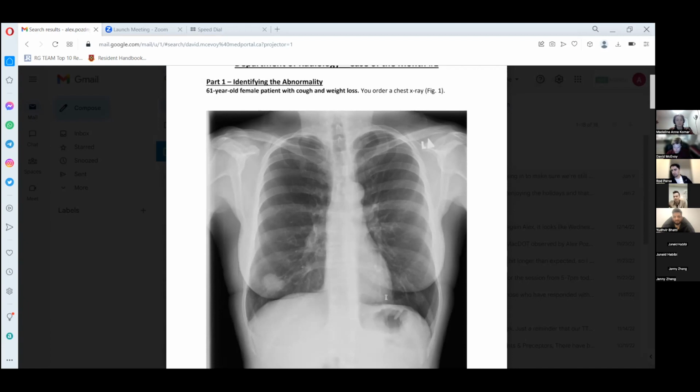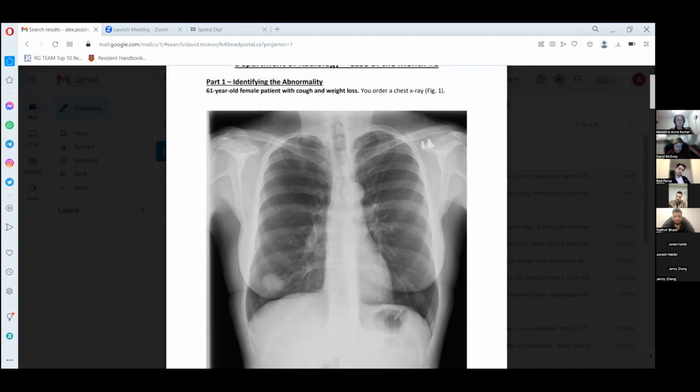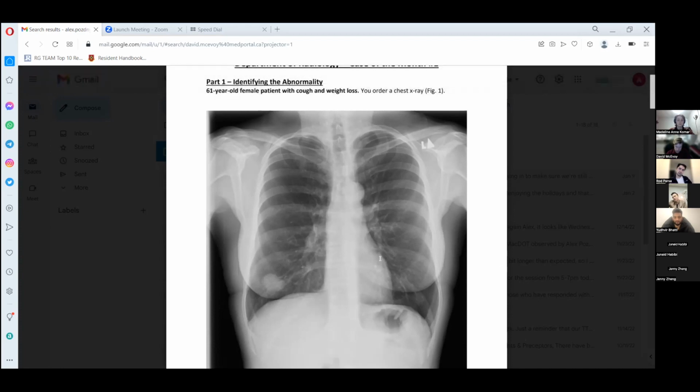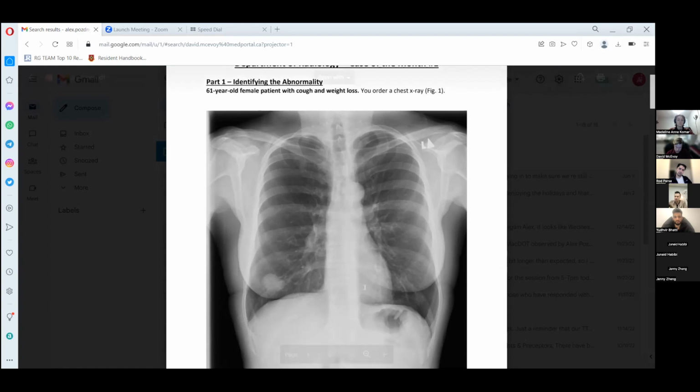So the important thing to note is that the patient is kind of facing you on the radiograph. So their left becomes your right. So that's why we have the heart contour more on the right side from us, but it's actually the patient's left. So we call this the left side. So this would be the left hemidiaphragm. This would be the right hemidiaphragm. This is the heart contour.